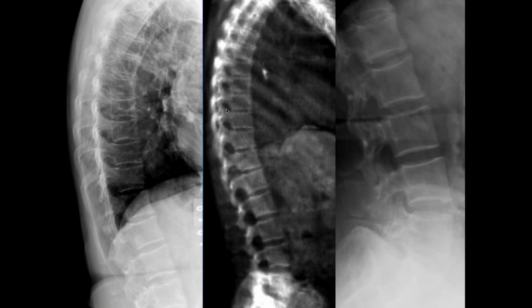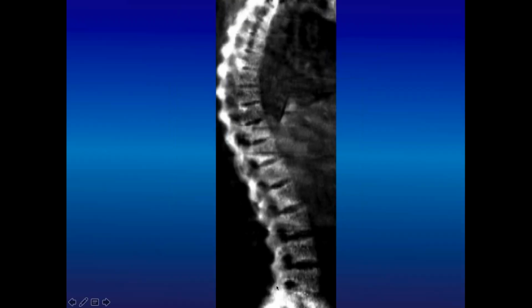And here we can compare it with the radiograph, thoracic spine, lumbar spine. And clearly you can see that the spatial resolution is much greater with the radiographs, and so it is more reliable than VFA, particularly for the mild fractures, but nevertheless, in this case, it is easy to consider this a normal study. Often with the dual energy approach, one may get some artifacts from diaphragm motion, as you can see here.